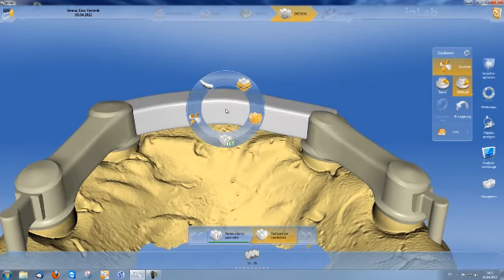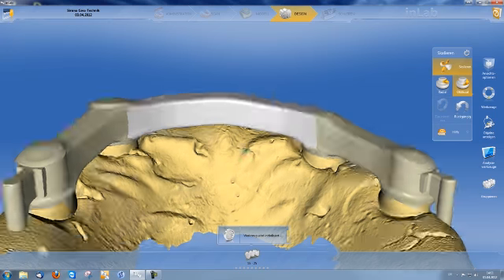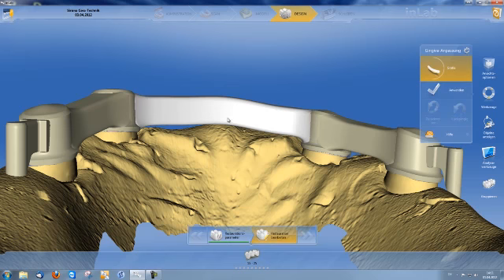As the last parameter, I can view and alter the gingival adaptation. I click on the Fit tool and move the controller upwards in order to create a clearance. I move the controller downwards into the minus range to create pressure on the gingiva and confirm this with Apply.